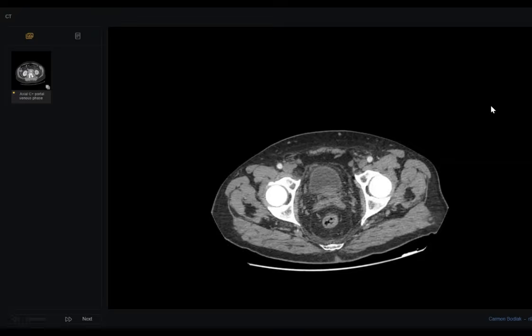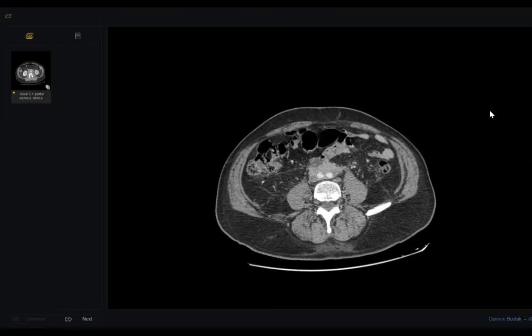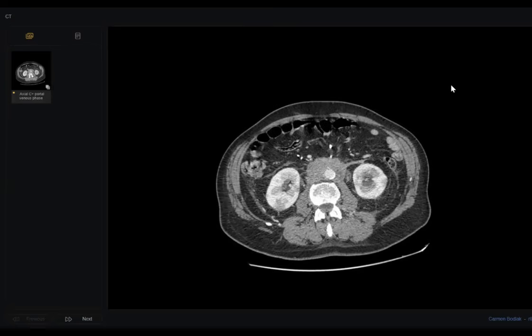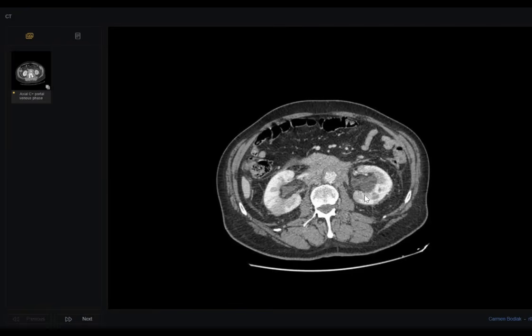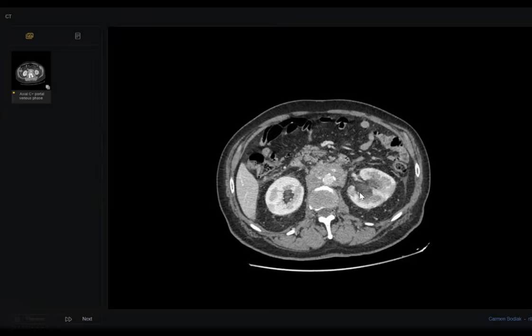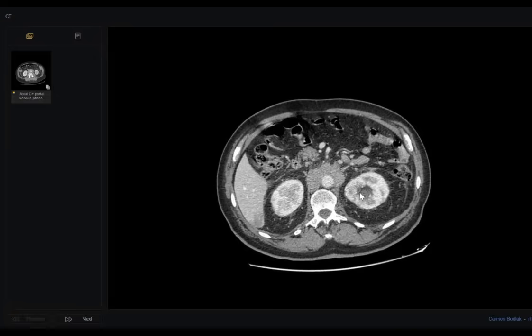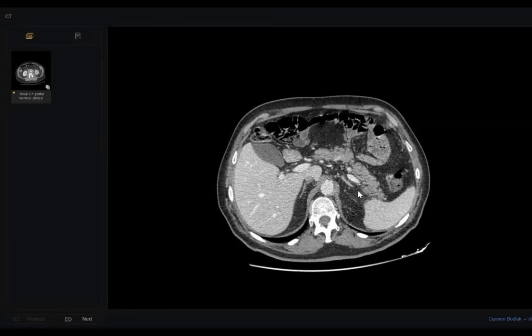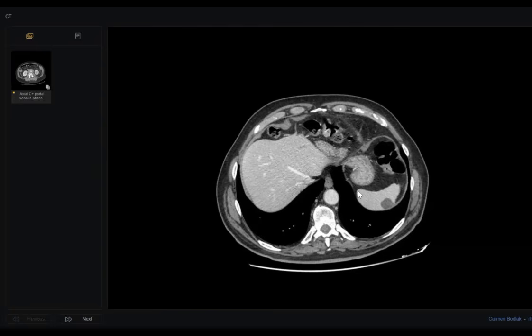I also have to check the liver for any biliary system involvement. I will urgently refer the patient to the clinical team for possible insertion of drainage for this hydronephrosis. I also have to check the serum markers for IgG4. Recommend steroid therapy.